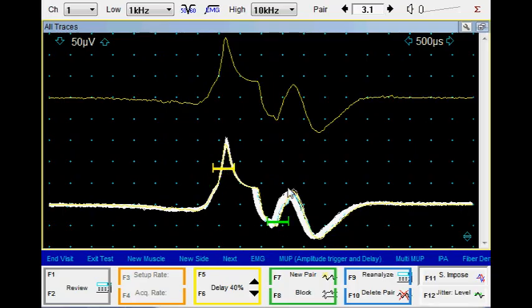This is my second window. Again, I'm going to put it halfway between the peaks. That's where the signal is at its sharpest. I can already see that there is one trace with blue color. It has a very high interpotential interval outside the 3 standard deviation limits. Going to normalize this window.